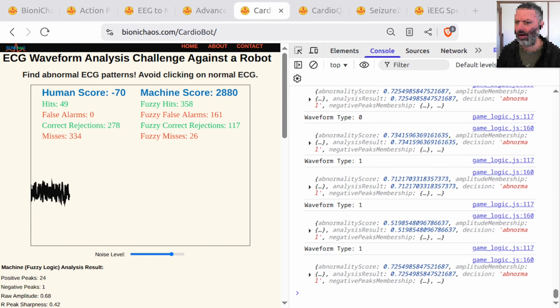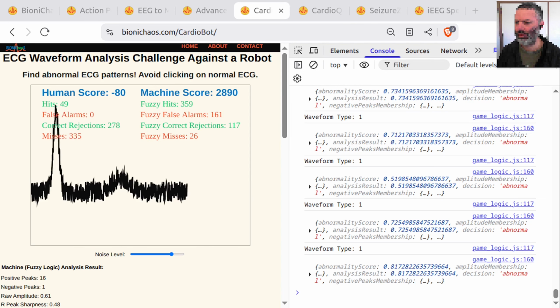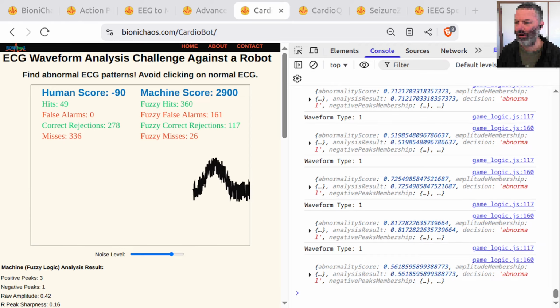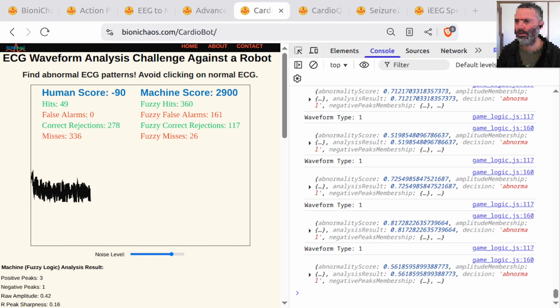That's a key clinical measure for ventricular function, and it's now explained right beneath the visualization. The pointiness score is official. It's taking a complex concept, ventricular depolarization duration, and explaining its simple geometric representation on the screen. And finally, the fuzzy logic model explanation.